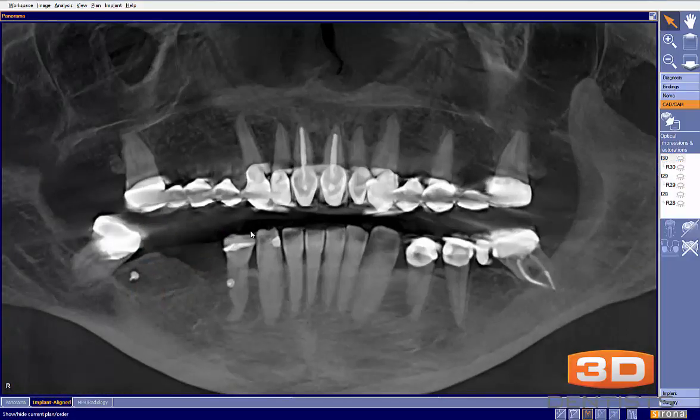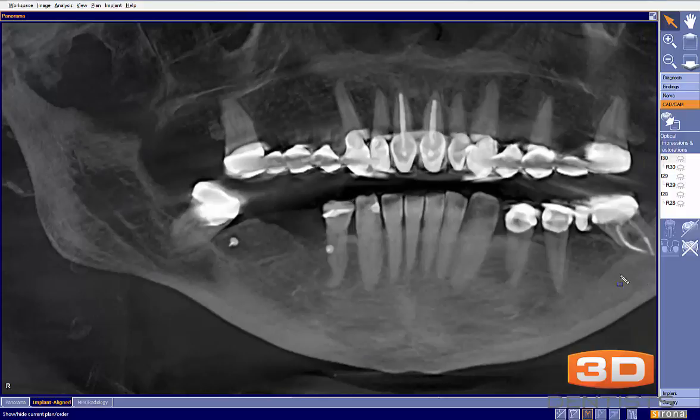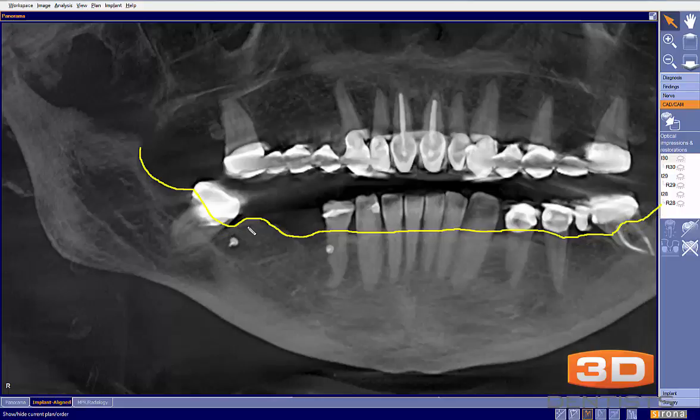So my first thing that I notice when I look at this is the ridge contours. So I want us to start taking a look at our bone level, which looks like so, pretty much across the arch. And notice that we have this big hump right here. So when I see that, I think of reduced restorative space, and I want us to start thinking about reducing that bone from a restorative perspective, reducing that bone down to make it more hygienic and more level with the adjacent implants, and that will give us more restorative space here.